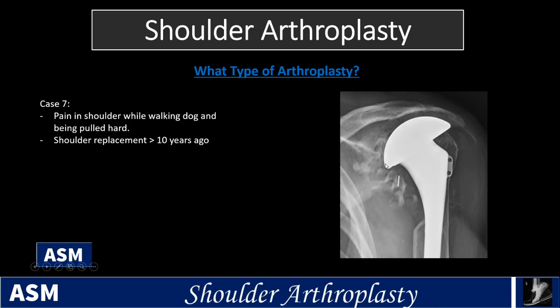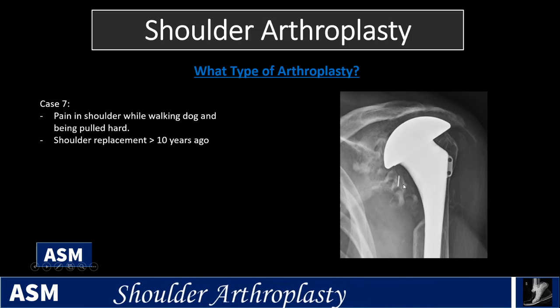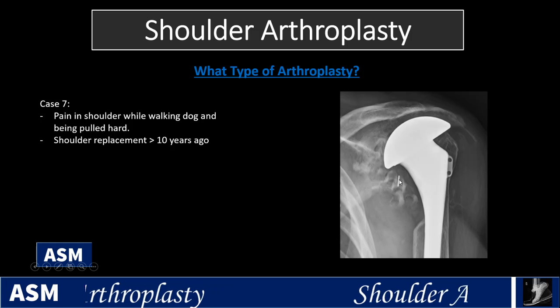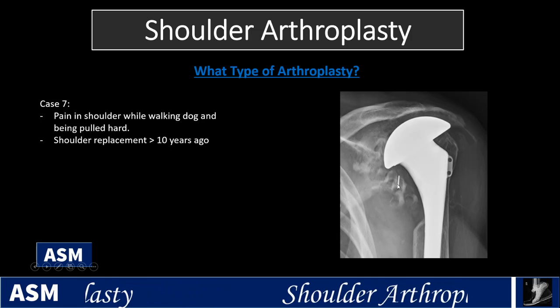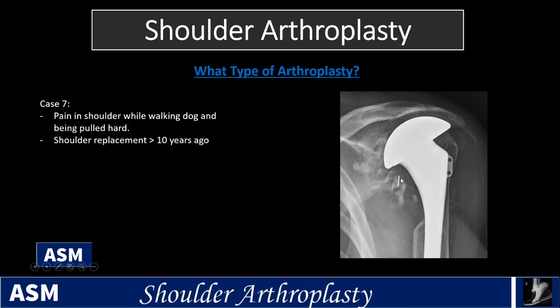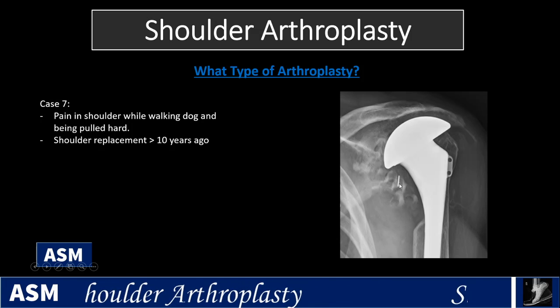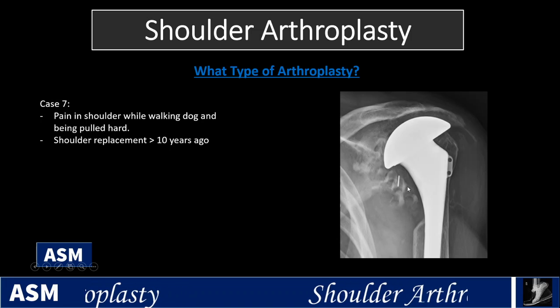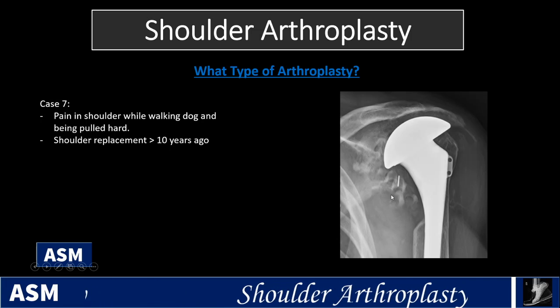Well, if you look at the glenoid side, you do see that marker for the glenoid, but that's usually like this, and it's down here. And if you look carefully, there are these loosened sort of linear things with radiodense material surrounding it here and here and here, and the glenoid itself looks eroded. So there's something wrong here, and this is probably a displaced glenoid component.